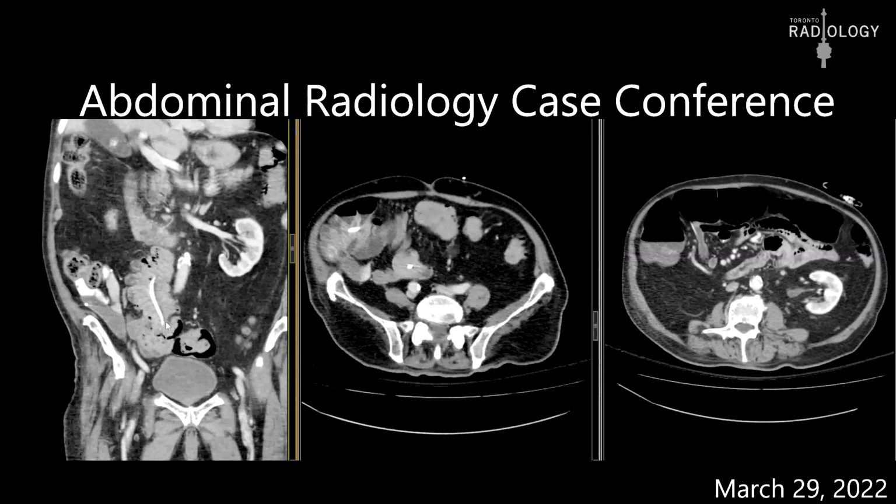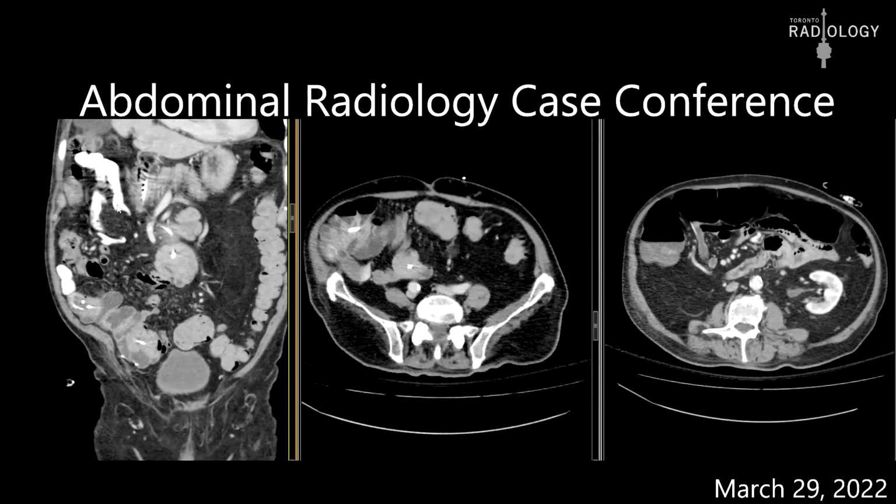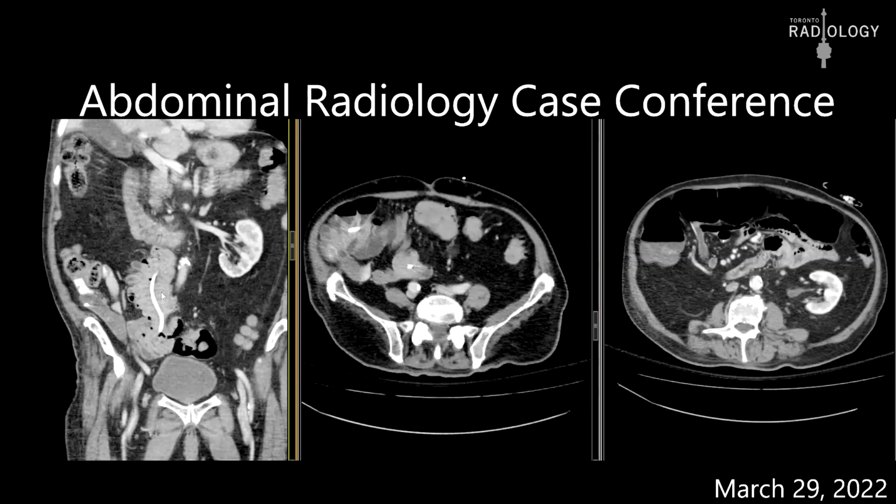And we see here a different pattern. This is not really intussusception, because the previous one did look like intussusception, whereas in this one, it does not. But it has this weird appearance.